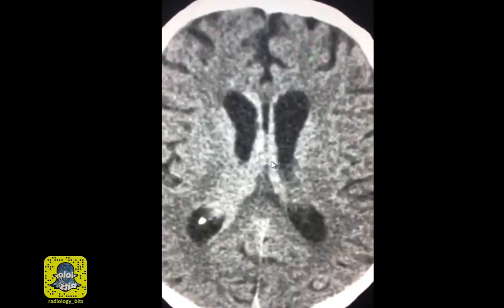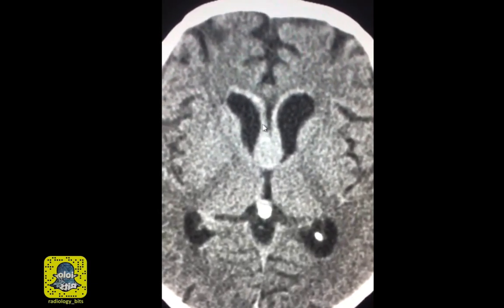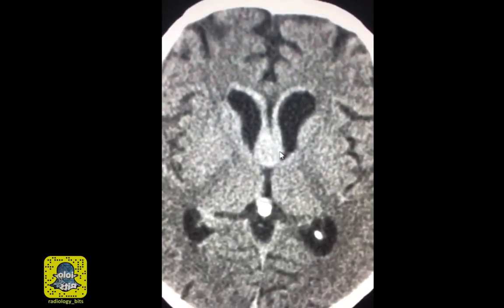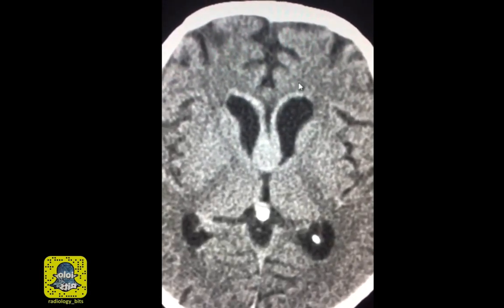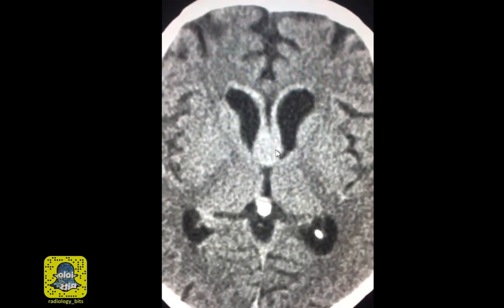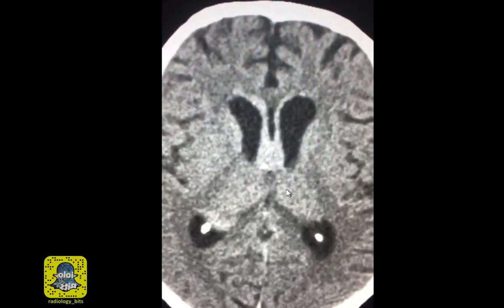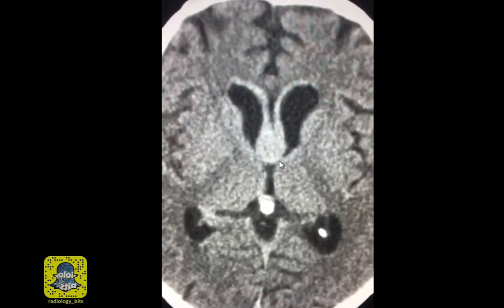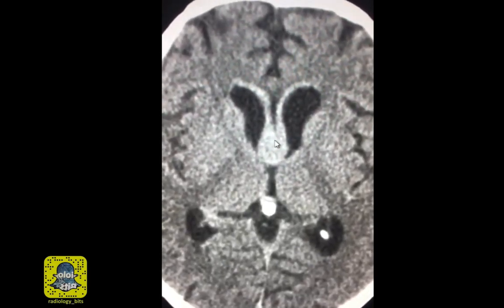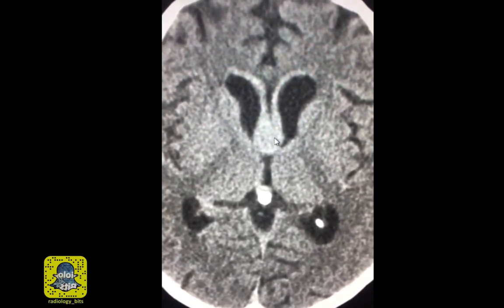We also agreed that the clinical presentation of infection would be different, and the appearance would also be different. You'd have thin enhancement in ventriculitis without nodularity. More so, with ventriculitis, you might have associated periventricular edema, which is not the case here. Then we talked about things that could spread along the ependymal lining, including lymphoma, metastases, or primary tumors. We also discussed the fact of some neoplasms being spontaneously hyperdense without intravenous contrast, and those would include meningioma, lymphoma, germinoma, and medulloblastoma.